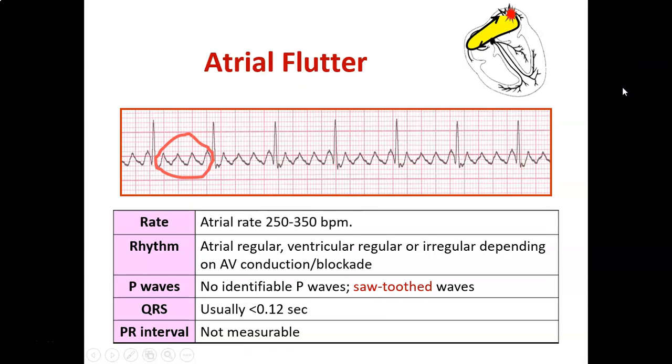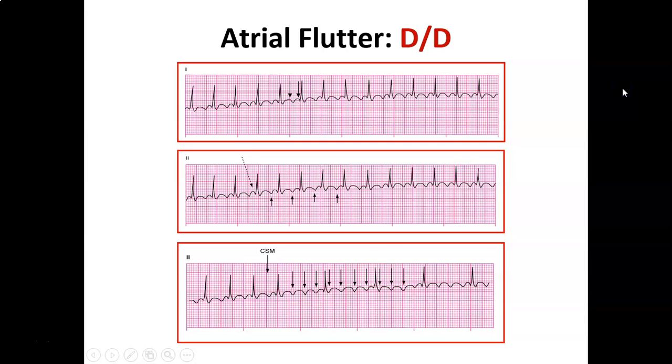So this is your atrial flutter. Look at this rhythm strip on the top. Here heart rate is exactly close to 150: 2 big boxes, 300 divided by 2 is 150. And here our differential diagnosis is sinus tachycardia versus atrial flutter with 2-into-1 conduction. So in your clinical practice, sometimes a patient comes with the heart rate close to 150 and you are not sure whether this is sinus tachycardia or atrial flutter with 2-into-1 conduction.